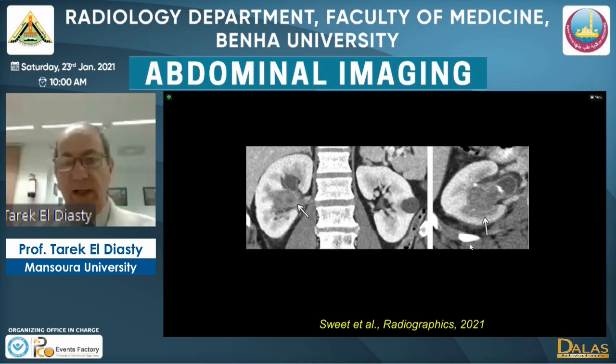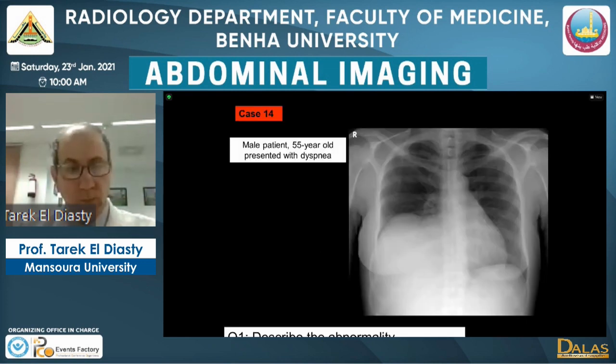And also, like what we summarized at the beginning of the infiltrative type, this is a central renal mass with an ill-defined interface between it and the parenchyma, and it obstructs or invades the renal sinus fat and the renal parenchyma posteriorly here. So this is a case of renal pelvic tumor, or what is called urothelial cell carcinoma.